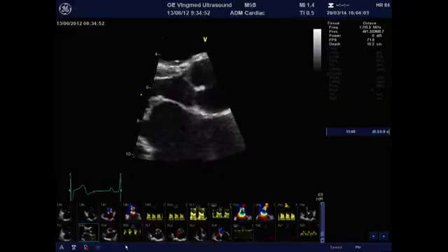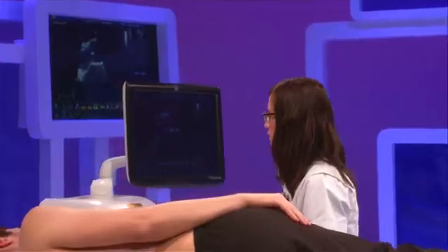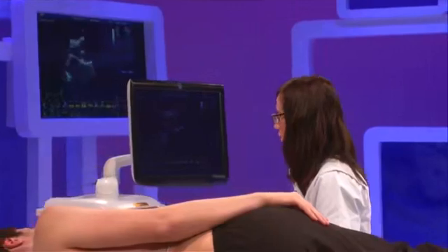This is a technique which can be done in clinical practice only when you have discordant measurements between the mitral valve area by planimetry, the mean gradient, and also the mitral valve area derived by the pressure half-time. It's a more tedious and more laborious method, and it's rarely used in clinical practice, but when you have discordances, you can always use it.